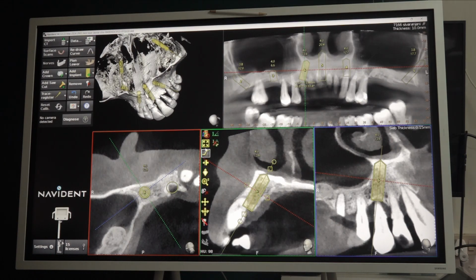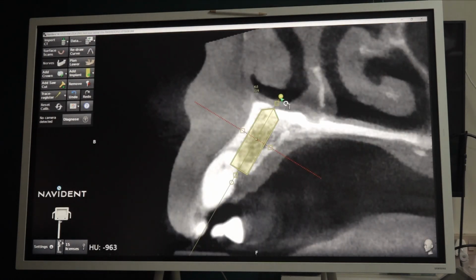Okay. So either you can go like this palatally. If you tilt more palatally, you will get longer bone. If you go like this, you will get shorter bone. So either palatal angulation, or you can start the drilling here and come. This is also okay. Straight forward here is like this, 3.75 into 13 or 16. Okay, give me so much in front here. So mostly around 39.